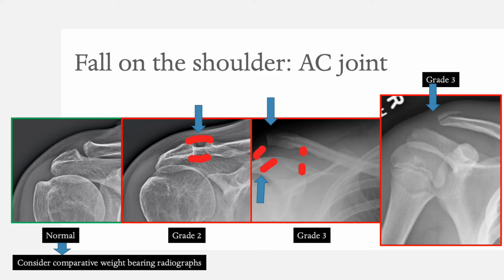One point to be very careful in children is that oftentimes when you look at the proximal humerus, you will see something that looks like a fracture line, such as in this case in the proximal humeral shaft, and essentially this is a pseudo fracture. So it is the proximal humeral physis that you are seeing in obliquity that can look like a fracture, so be careful for that.